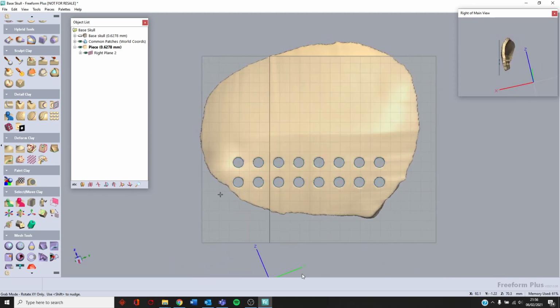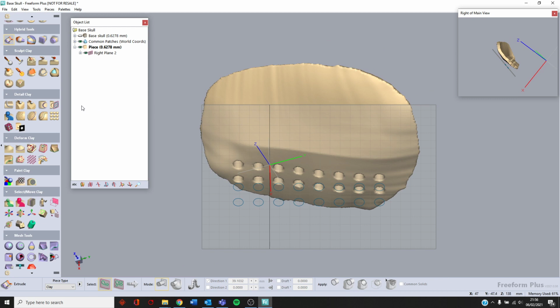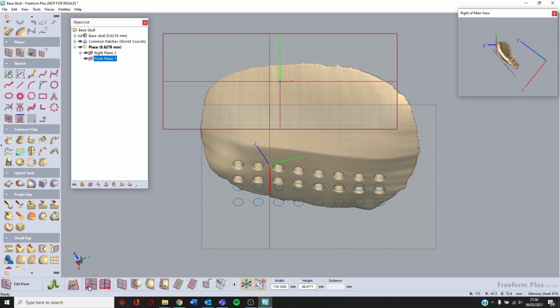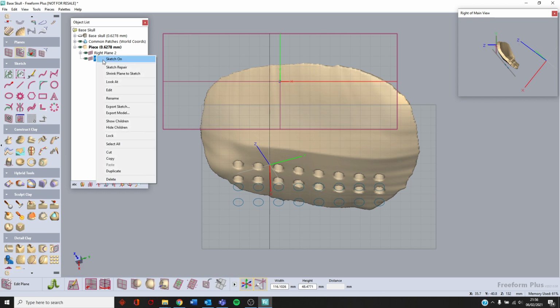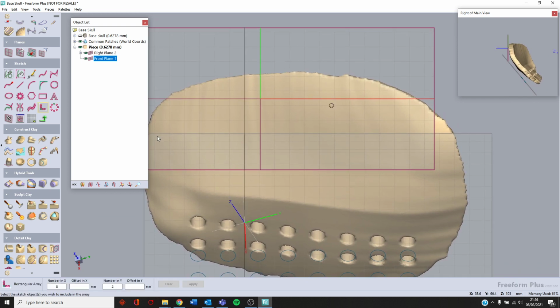There we go. So now what I'm going to do, change my view ever so slightly, add a new plane, position normal to my view. I'm going to sketch on it. Planes are infinite, so it doesn't matter that it doesn't cover the full area that I want. It will never end. So if I sketch again, around there, type in a numerical value of 5 millimeters, so I know it's controlled in a manageable way. Add the IA as well.